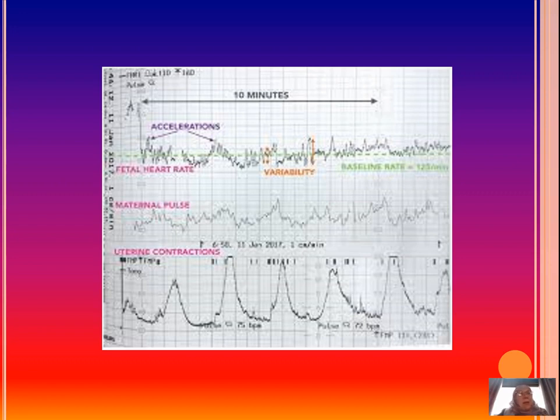So in a normal labor, you should have 3 to 4 contractions in 10 minutes, and you can count this easily on a CTG when you know what represents 10 minutes. Usually, and you can see this here as well, there are rows of numbers on the CTG that represent 10 minutes. So every 10 minutes you get some numbers on the CTG at the contraction part.